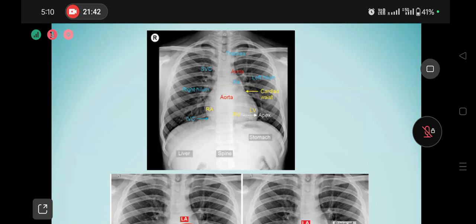Ventricles do not clearly appear in the frontal X-rays. Therefore, you often should do additional views. Unfortunately, these days we don't do additional views in chest X-ray because everybody wants to jump into echoes. But if you are in a place where echo is not readily available, or you want to save some money for the patient or something like that, you always do a lateral chest X-ray.